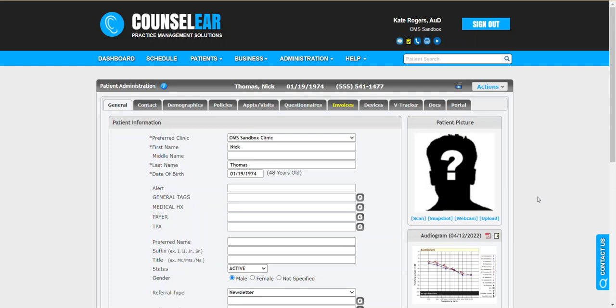Okay. Now, in rare instances, you may be attempting to program hearing instruments. You go into CounselEAR Noah Cloud, you try to open a previous session to maybe program some settings or review the settings, and you may receive a message that the module cannot be opened. In those cases, our first recommendation is always to reach out to the manufacturer of that hearing instrument because they're going to be the best person to support that issue. If there's something they can address right away, obviously they will. They'll check to make sure that their module, for example, is the newest version or anything else that they want to check through. So first step is to check with the manufacturer.